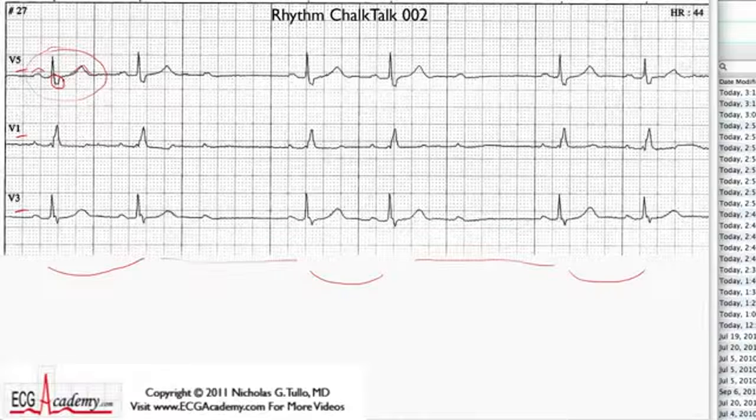If you measure the entire QRS complex, it's only about 110 milliseconds. So this wide S wave and this RSR prime in V1 suggests that there is an incomplete right bundle branch block going on. But that's something for a 12 lead to confirm. Anyway, the PR interval of this beat is about 200 milliseconds. It's at the upper limit of normal, right about 1 big box.